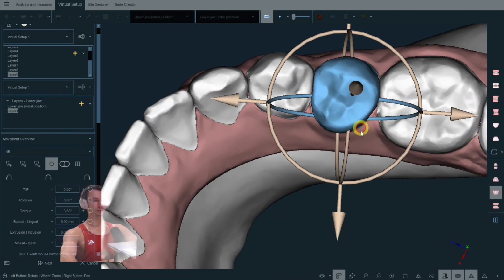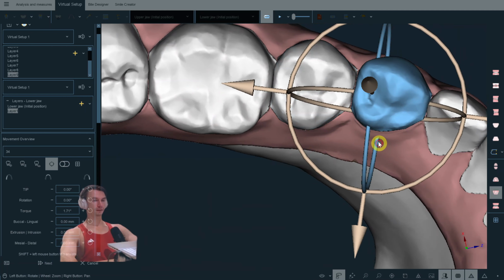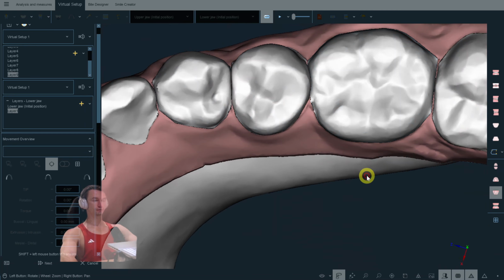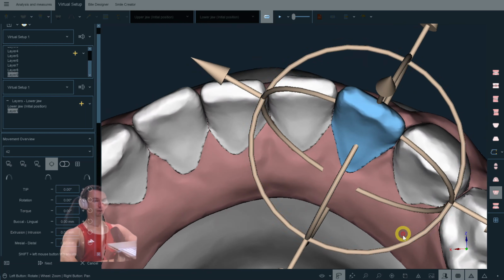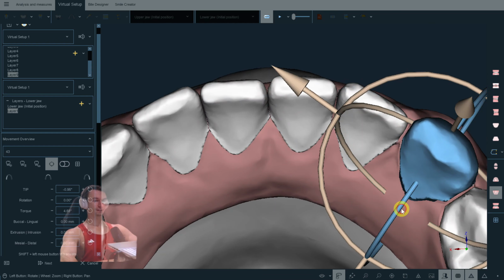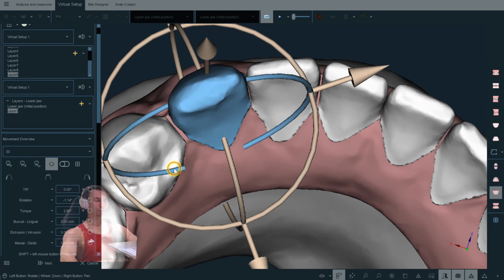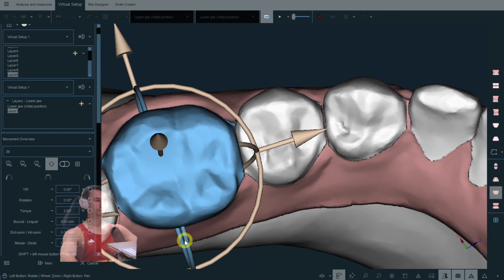Look, guys, if there are small rotations, we never do anything about that, because there is 99% relapse if you try to fix those minor rotations, because it's made by nature to chew, you know, this is a very stable occlusion, and if we make those changes, there is a high chance of relapse.